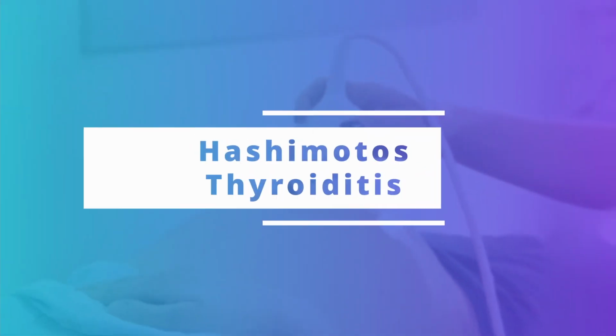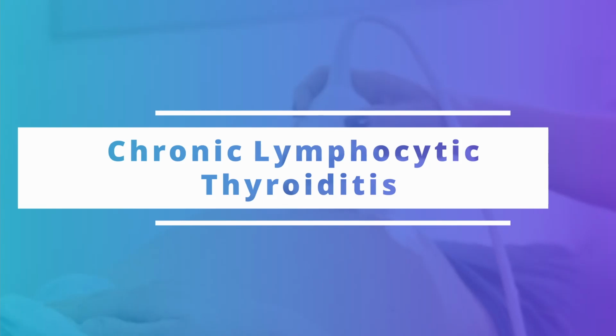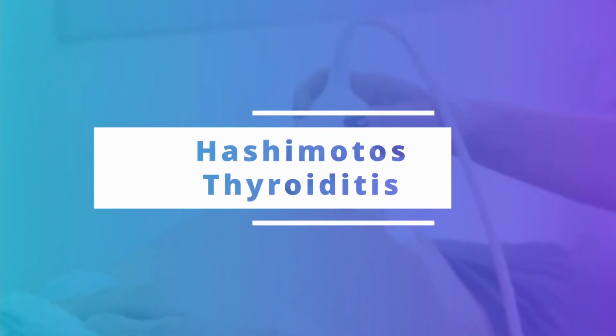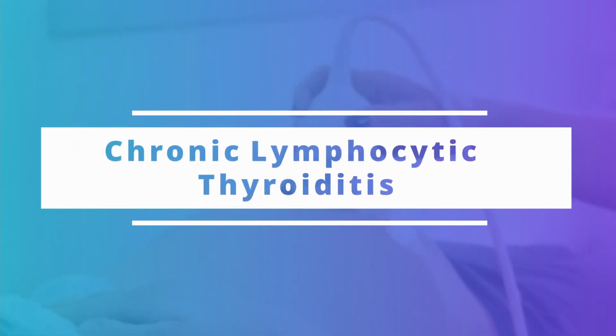The same sonographic appearance, however, can also present in what is called Graves' disease. In this talk, I'm not going to dwell much on Graves' disease, which can overlap in sonographic appearance with Hashimoto's thyroiditis. However, you are supposed to take note that the major differentiation between Graves' disease and Hashimoto's thyroiditis is made from laboratory tests and findings.